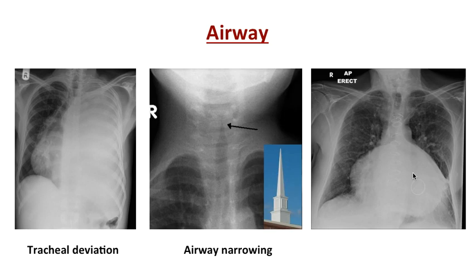In the third X-ray, yes, obviously you may make a note of the cardiomegaly, but you can also see that the carinal angle is widened, which can appear in left atrial enlargement. So there is a widened carina. Whenever you are looking at the airway, look at the carinal angle, look whether it is narrowed or not, and also look whether it is displaced or not.